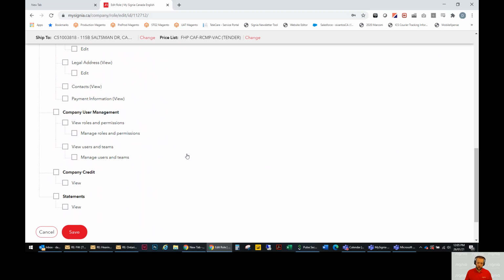If you want your users to add more people, then that's fine. If you do want to allow people to add other people, they can only add the same role as them. So you can't have a default user, such as a receptionist or someone like that, create a business admin. That's not possible. So again, we have limited the risk to everyone.